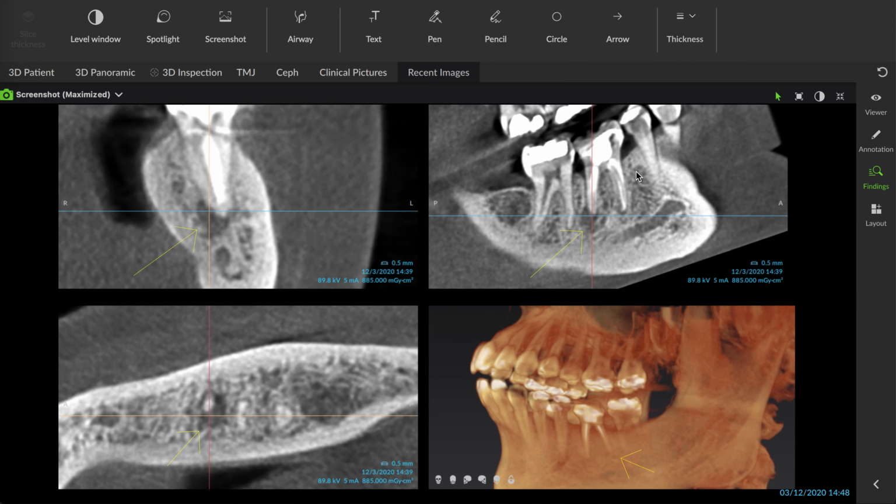And this angulation is a little misleading because of the way the CBCT works, when you grab it and zoom into an area, it'll appear like we're on the right side, but this is the lower left. And you can see how large that abscess is, especially on that distal root structure, and how big that bone destruction is there.